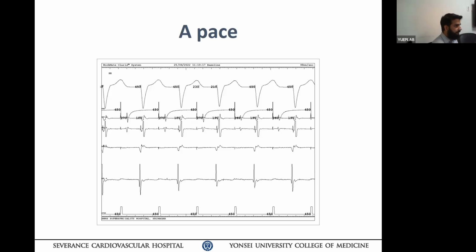So was it dependent on pacing cycles? Yes, it will. The LBBB morphology increased as we increased the pacing. So just to prove that this was a Mahaim fiber. Okay, so this is the exciting case, and now we should explain the AV dissociation-like pattern and also the transition in morphology a little bit. So can anybody explain that phenomenon we saw from the tachycardia ECG?